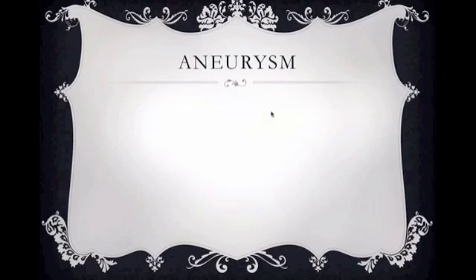Pretty cool stuff, huh? So going on to the A of elevation is our aneurysm. Aneurysms in bold, capital, extremely difficult to pick out. All right, it's going to be kind of hard for us to diagnose this in the EMS setting.